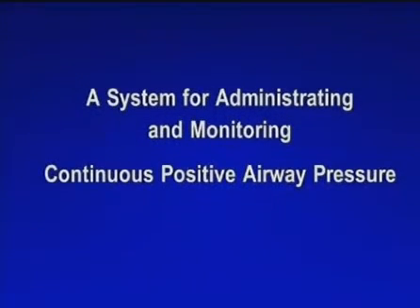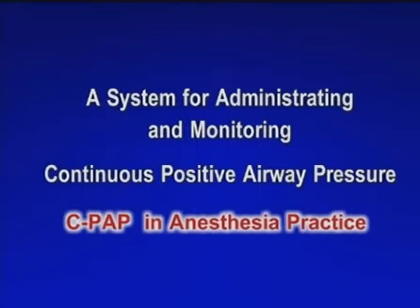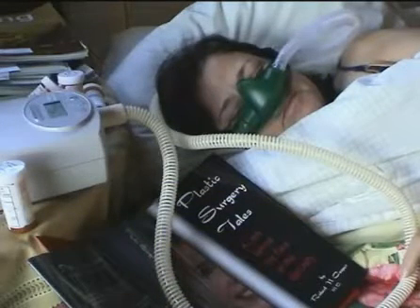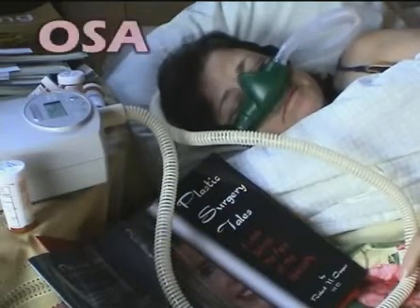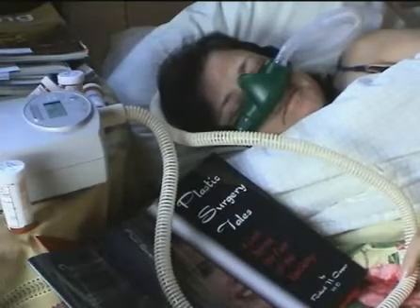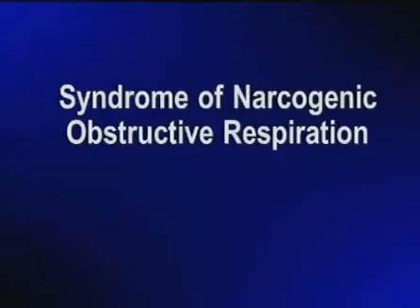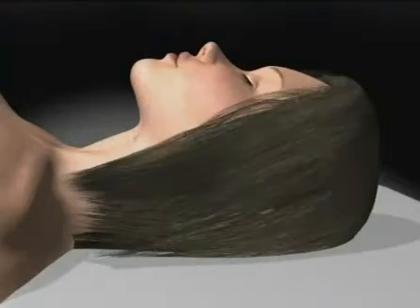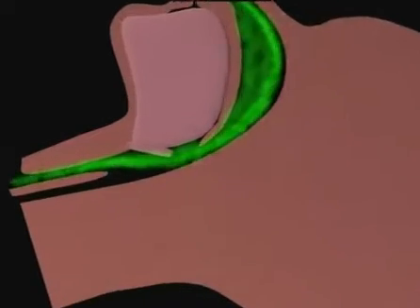A system for administering and monitoring continuous positive airway pressure, CPAP, in anesthesia practice. Nasal CPAP is a well-proven treatment for the syndrome of obstructive sleep apnea, or OSA. There is a comparable condition encountered in anesthesia practice that we have termed the syndrome of narcogenic obstructive respiration, or SNOR.